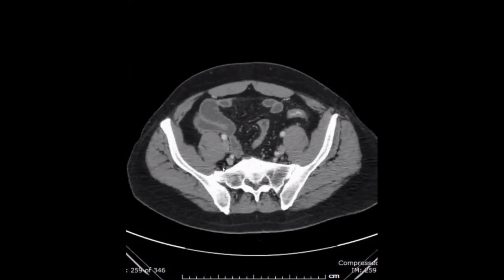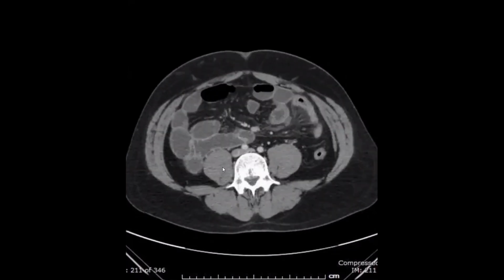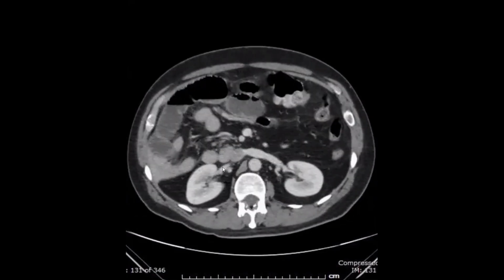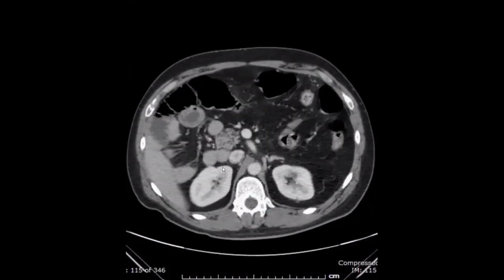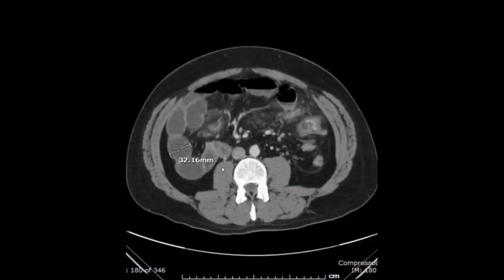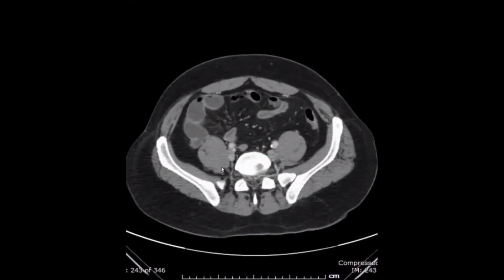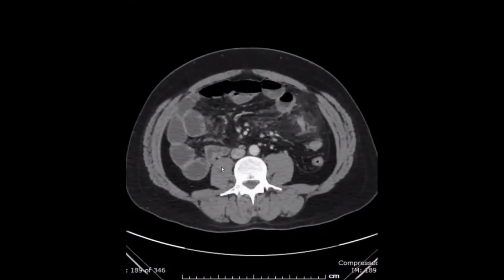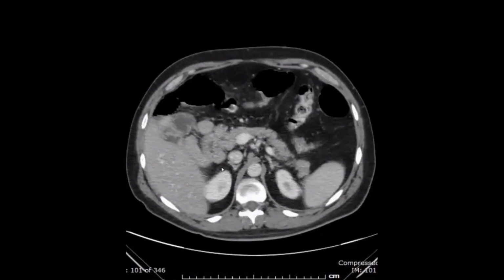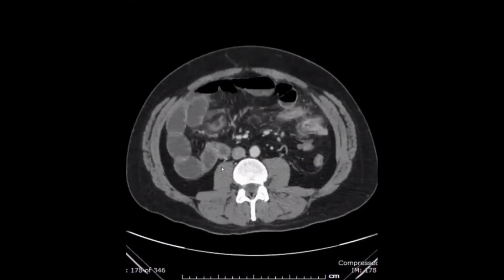I have been provided with CT with intravenous contrast in the portovenous phase. I see some smudging of fat within the left epigastric region. The bowel loops seem dilated, small bowel dilated. I would like to see the point of transition within this left.